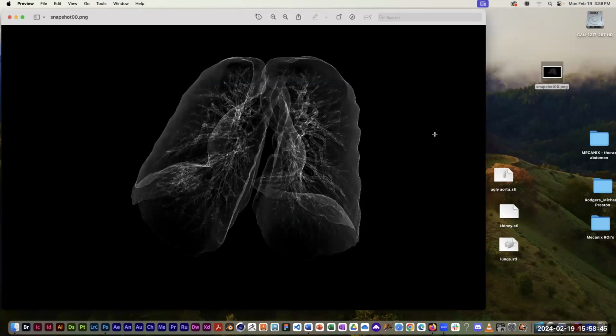So there's already a Dropbox up in my courses for segmentation. So just try the different segmentation options. Pick one that you like. Export an STL, save it as or view it as a 3D surface model. Export the STL. Bring it into MeshLab. Smooth it if you want. And just save a PNG file.